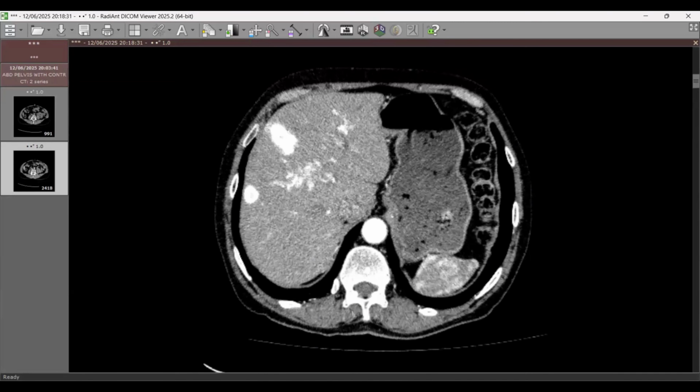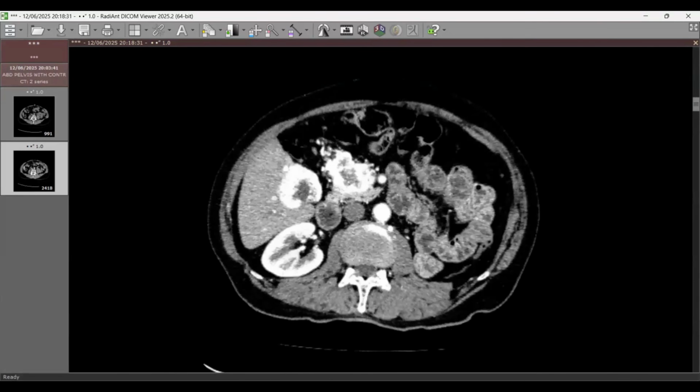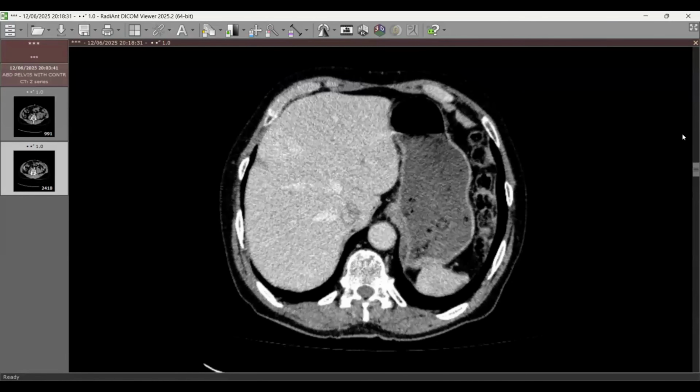Okay, so I just need to add something, Dr. Sabha. Whenever you see multifocal lesions, your top differential should be mets, and then try to look. These are hypervascular arterialized lesions, and don't worry, this is just a practice forum. You can make as many mistakes as you can, but just try to improve your observational skills. When you have spotted multiple focal lesions, your top differential should be metastasis, and then you should be looking for all the organs, pancreas, gallbladder and kidneys. Don't worry, but just try to focus on these points.